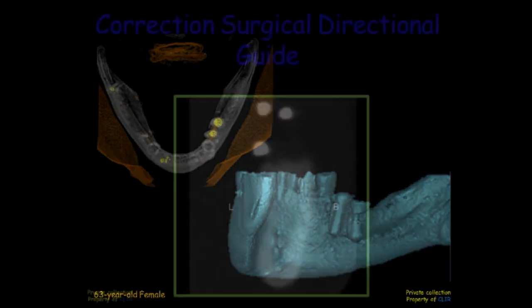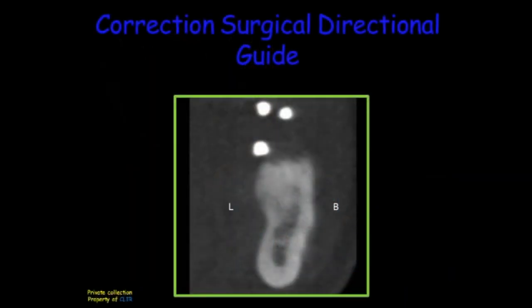As you can see on this cross-sectional cut, the two occlusal and crestal points are lingual to the bony envelope. The two green occlusal and crestal points are the exact ones. If you follow them, you will be directly into the bony envelope. So by using the measurements feature in the 3D software, we can calculate the distance. Let's say it's 2 millimeters.